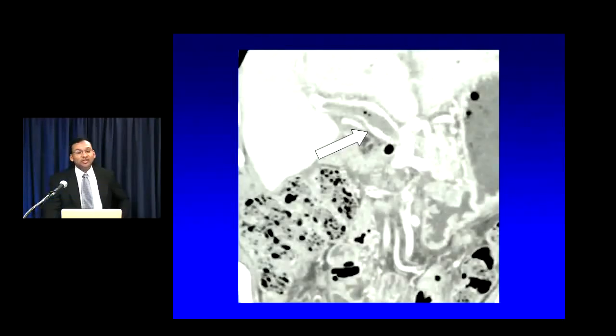Now, this is a diagnosis that you really shouldn't miss, provided that you take the time to actually look at the vasculature in every postoperative case. This has to be a part of your standard search algorithm. Every time I look at a post-Whipple, I'm looking at the portal vein, looking at the confluence, looking at the SMV. And as long as you look at those vessels, you're not going to miss this diagnosis.